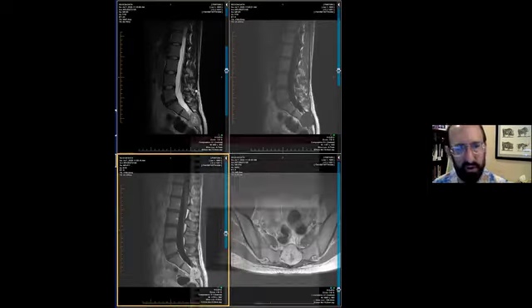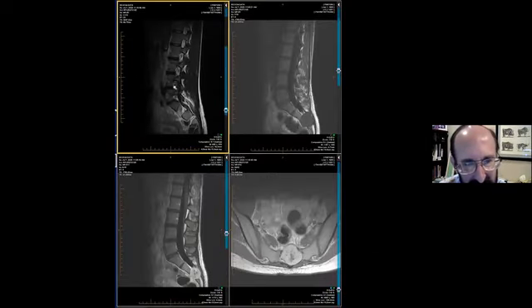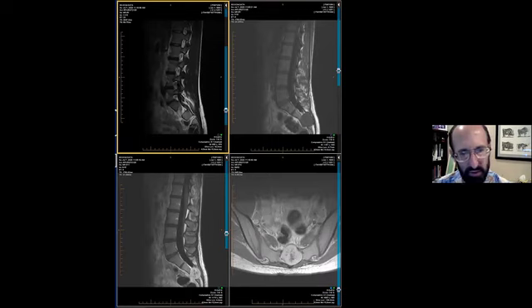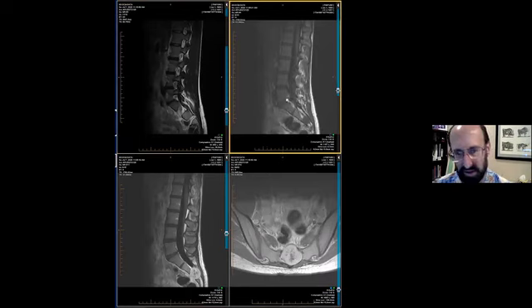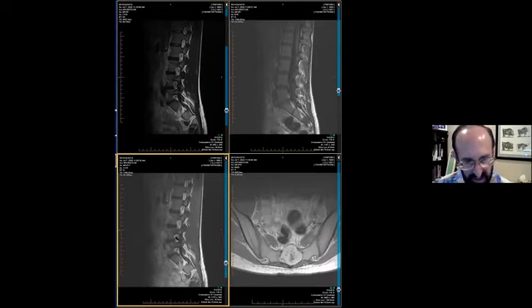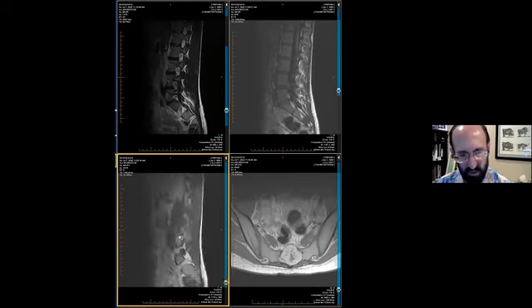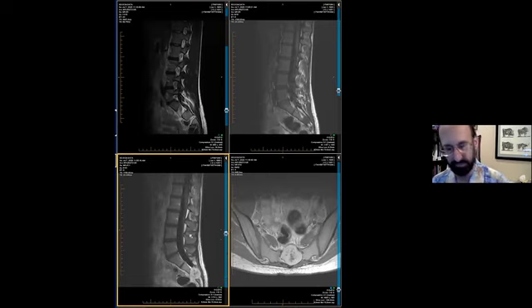I'm just going to show you one of the features. I wondered whether this was too large right here in this case, that maybe the patient actually does have multiple schwannomas because this nerve root seemed disproportionately enlarged. I passed through that. You can see that it shows enhancement. So I wonder in retrospect whether I missed it and that the patient actually had multiple schwannomas or neurofibromas.